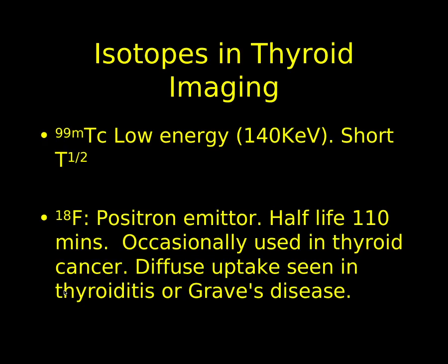Well, just to note it here, because it's as good a place as any, as a general rule, there should be only very, very low-grade uptake in the thyroid gland in an FDG PET scan. If you see diffuse increased uptake, that may be due to thyroiditis or possibly due to Graves' disease, so that's something that you may certainly wish to mention in your report.